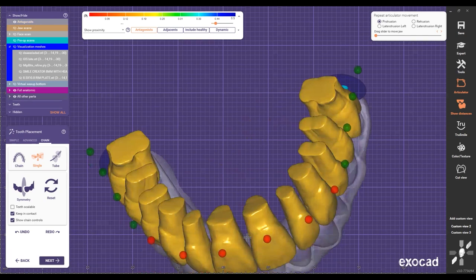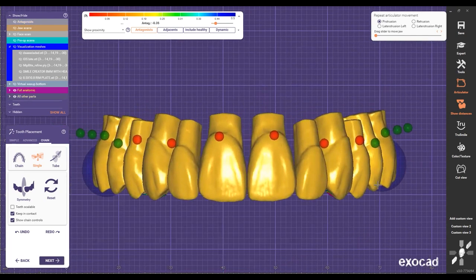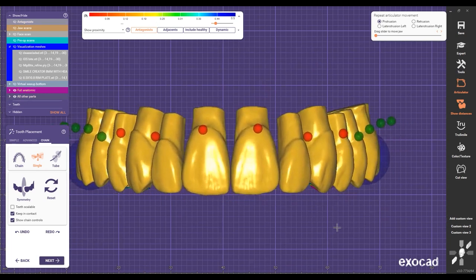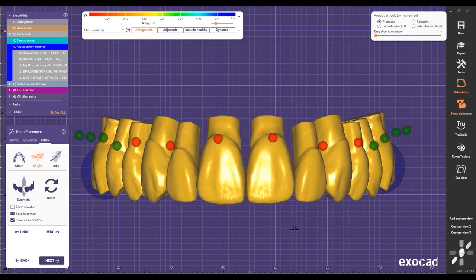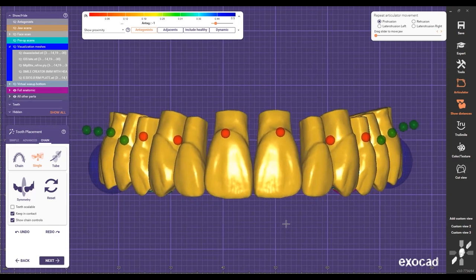Let's go to the second premolar. The background line here, the horizontal plane, and I'm just gonna do the same thing here. I'm gonna do this, looks good. Perfect, let's go down. Everything is there. Remember, this is kind of like the base, the base plate on the articulator when the guys are setting up the teeth, right? You have a base and then they set it up so everything looks flat to all the cusps following the plane of that base on the articulator. Same concept here, okay? So that's why I like to bring those ideas and digitize them and apply them here.